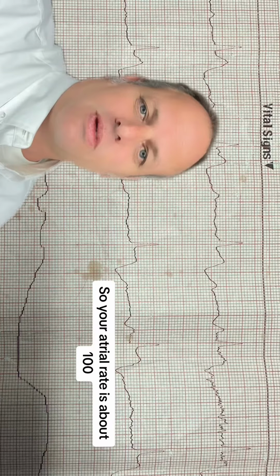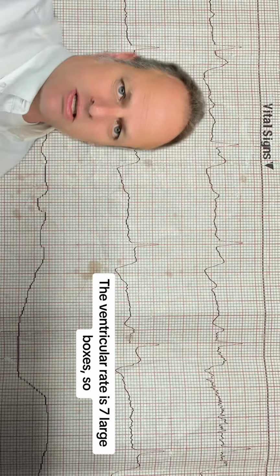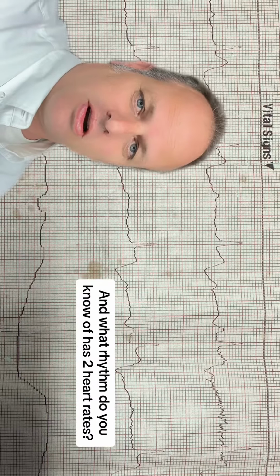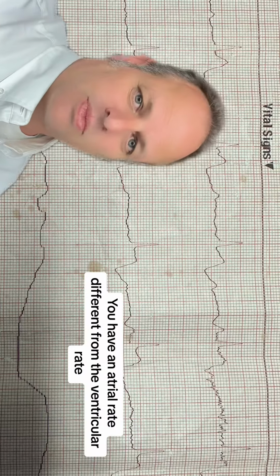So your atrial rate's about 100. The ventricular rate is 7 large boxes. That'd be 43. And what rhythm do you know of has 2 heart rates? You have an atrial rate different from the ventricular rate, 3rd degree heart block.